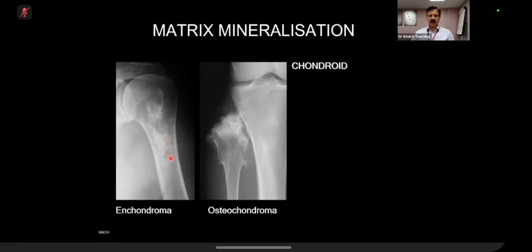And this calcification, remember, I taught you in the second chapter, 3 words: ring and arcs and nodules. So ring and arc type of calcification is quite pathognomonic for cartilaginous tumor, because the differential diagnosis is bone infarcts, where it is geographical serpentinous calcification. So this is chondroid matrix.